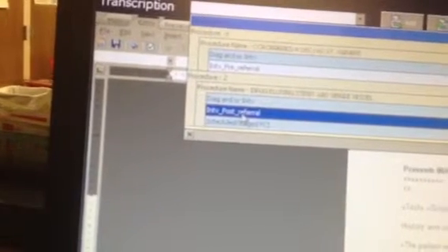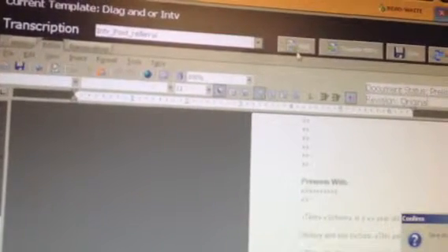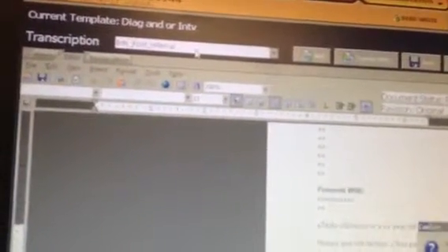So you want to go over to transcription, and you're going to choose, this time, interventional post-referral. Dr. Schomer chose pre-referral, because that's the report pre-intervention when he refers. And this one is post-referral, because this is the report that's post-intervention after he referred. So you select that, and then after you select it, you have to hit Add. Oh, it asks you if you want to save changes to draft. Yes or no, doesn't matter.